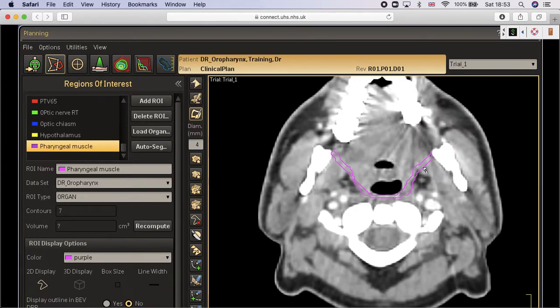It seems that it's a very interesting trick. So if you see this, some guidelines doing that, honestly, you can do it, but you have to understand 2 points. The first point, that the pharyngeal muscle will never extend there. It is attached to a tendon here called the pterygomandibular raphe.